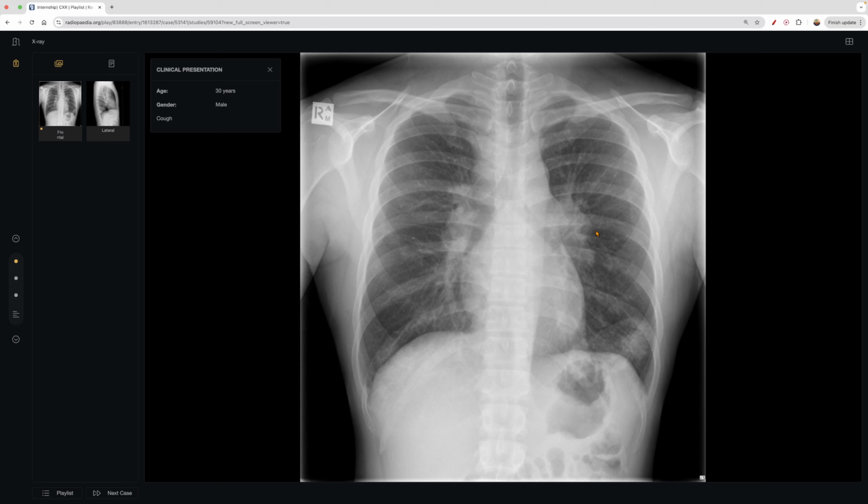Sometimes, yes, it is prominent, but it's a little too prominent. We'll talk about that in a second. And then you look on the other side, same ideas, looks fine. And then we see here, again, a little too prominent. Come back from the top. Mediastinum is a little widened, a little bit more widened than usual. Again, the way to know that is by seeing a bunch of normals, and you can go from there.